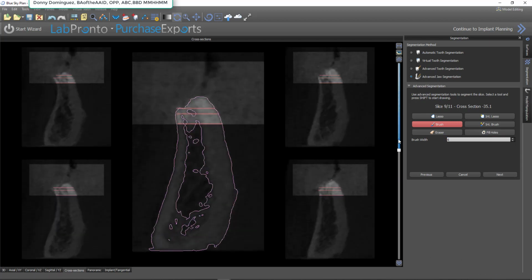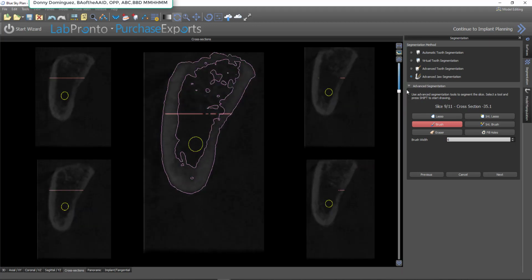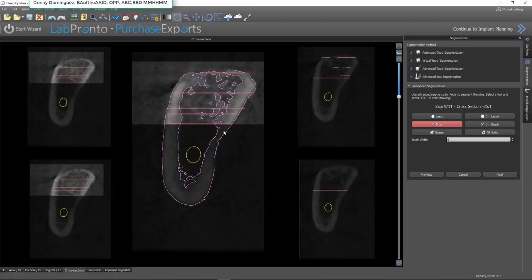Now let's go to the other end. Alright, right there. And I do need to use the eraser for the first time. Alright, now you didn't necessarily have to do that. I would recommend it. It's going to only make your life easier, because while you could export this in its current form, it won't be perfect, but combined with the other, it's going to be.